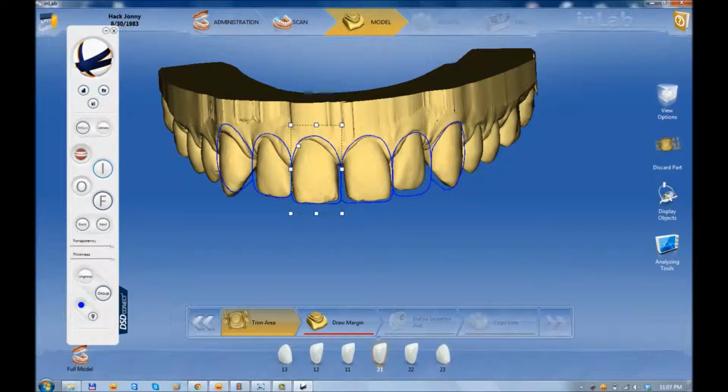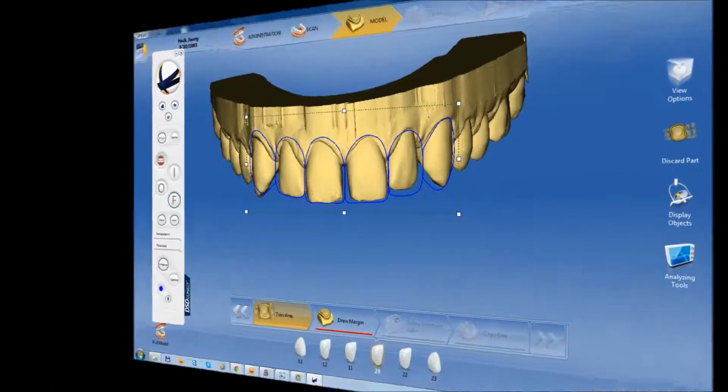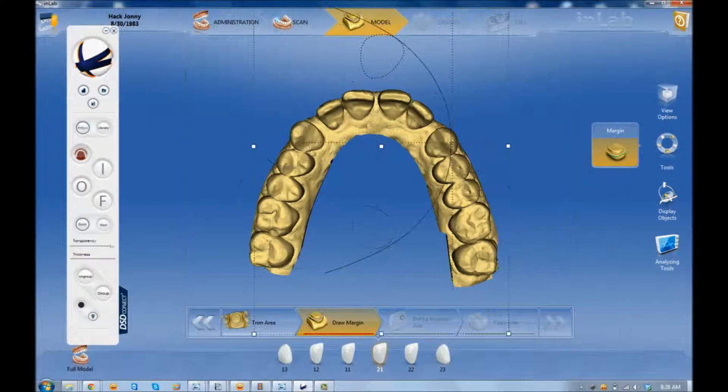Pressing the A button of the keyboard, the image with the axis and the incisal curve will appear on the screen or will disappear, as preferred, in order to check the calibration of the contours according to the 3D model. Pressing the R key on the keyboard, the image rotates 90 degrees at each touch.